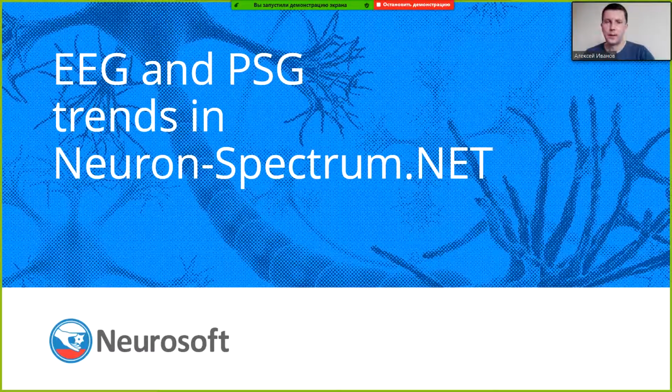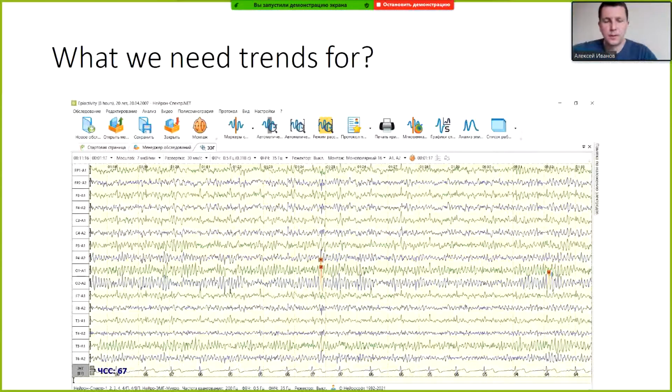Hello, in this video I'll try to show you how to use such a tool as EEG and PSG trends in neuronspectrum.net software for analysis of long-term EEG and PSG examinations. First of all, let's speak about what we need trends for.